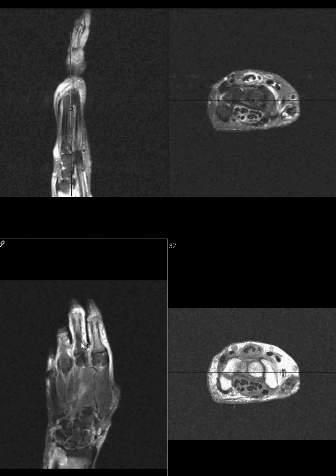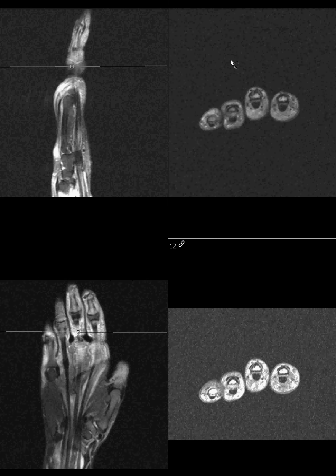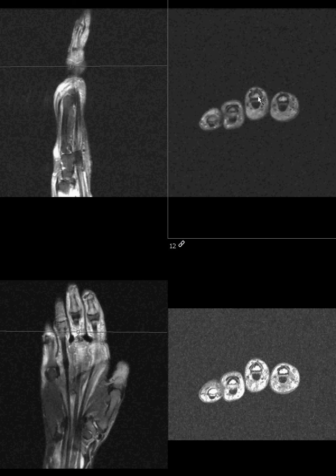also in the bone marrow in the fingers. And you can see it here on the axial images as well. And the question becomes, is that pathologic? We're a lot of times looking at marrow to look for inflammatory changes or post-traumatic changes. And when we see this, it makes it very difficult to evaluate.